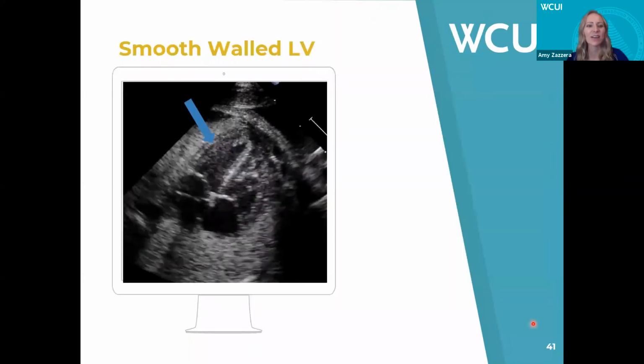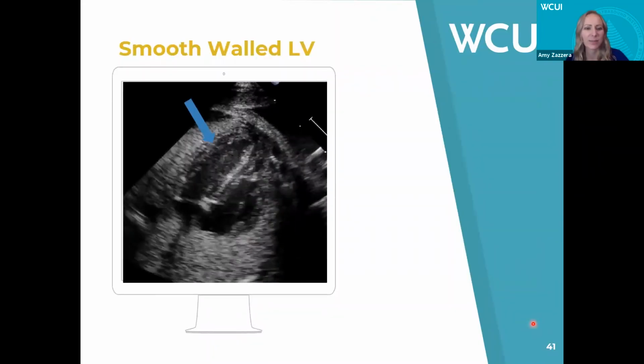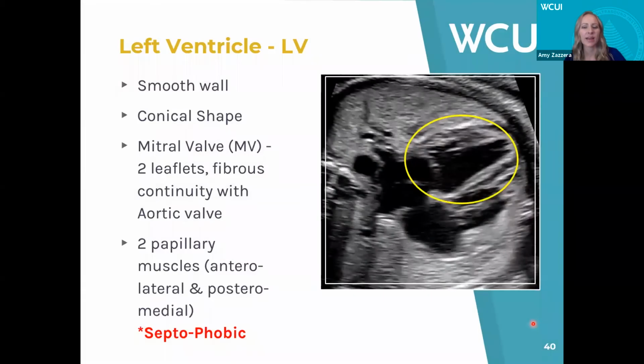And then one other thing that we just wanted to mention about the left ventricle, most reported EIFs are seen in the left ventricle, and associated with the papillary muscle configuration. In the LV.